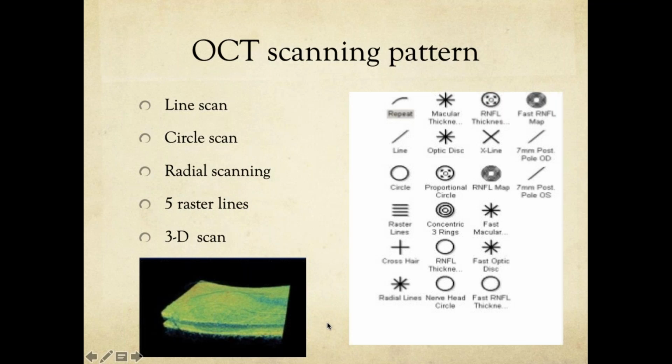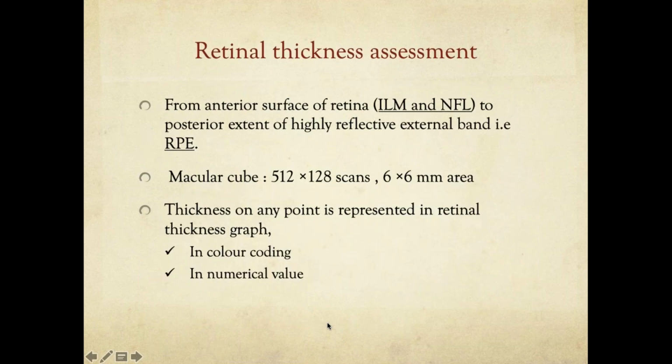So over here, what could be happening is, while you're focusing on the central macular thickness and saying that it's a normal thickness, 245, the overall macula might be going into atrophy and the macular volume could be decreasing. It could be 5.5, 6.6. So although the central macular thickness seems to be normal, the overall tissue around the macula is atrophic, and hence the vision is deteriorating. So when you're interpreting the OCT, especially the macular cube, when you have the 512 by 128 scans over the 6x6 or usually 4.5 by 4.5, you also have to look into the macular volume as well.